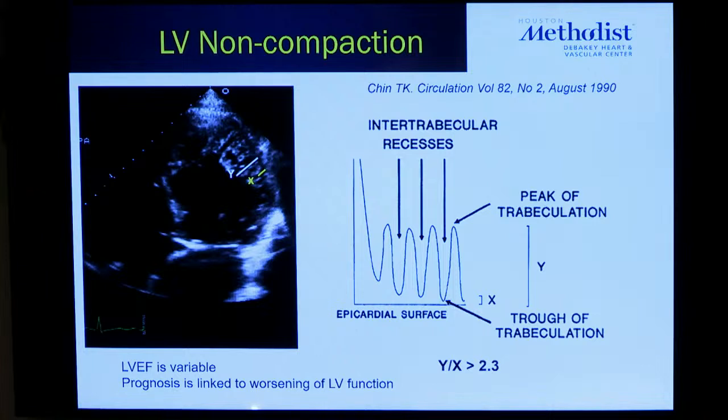Most of the time, it's an easy diagnosis to make. There are two sides of the story. One sometimes may not be as apparent and could be missed. Contrast echo can help at times. And there are other times when we may overdiagnose.